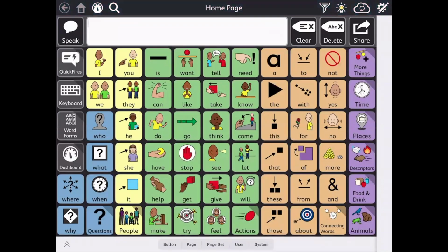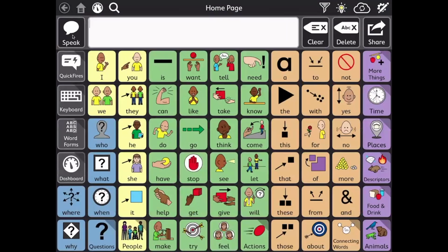So to get into it, it has the same kind of controls along the top, along with a new feature, which is a filter. We'll talk about that a little bit more. But we have our dashboard, which is the same as this down here, our search feature, and then ability to back up, editing, and then some tips, new tips and tricks.